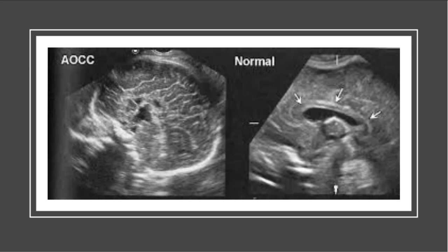And of course, if you see the abnormality of the ventricles, well, then you can kind of question and move forward with that. But if we don't really see that severity with the absence of the CSP and the teardrop shape ventricles, then you may not think to question the agenesis of the corpus callosum.